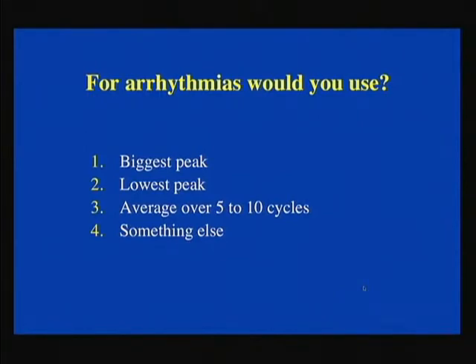If you're a cardiologist, you would average things over 5 to 10 cycles. Oh, great. There goes the afternoon. Something else. Anybody have any idea? Well, you didn't listen to Dr. Pellerito's talk, did you? Velocity ratios is one alternative, or the biggest peak.